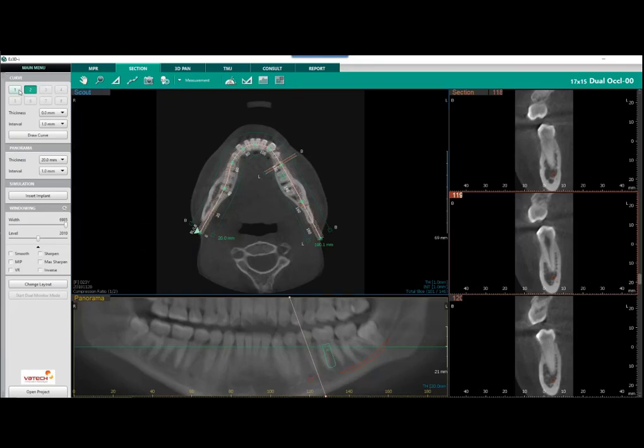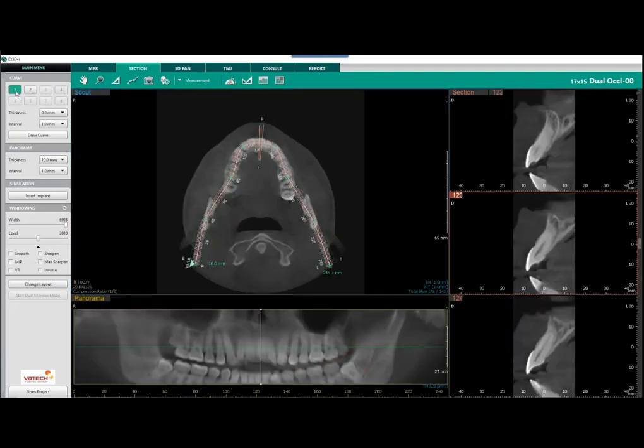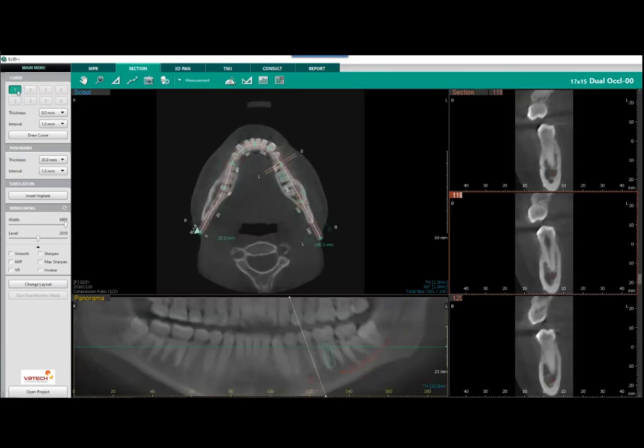Sounds great. So you'll notice up here 1 through 8, if we have too many curves, it's going to say, hey, you cannot draw any more curves. I can come up here, right click and say, let's delete curves. So now I'm back down to 1 curve. What I like about this window is it's going to save each curve that you've drawn on there. So that will categorize all of your curves through this window.